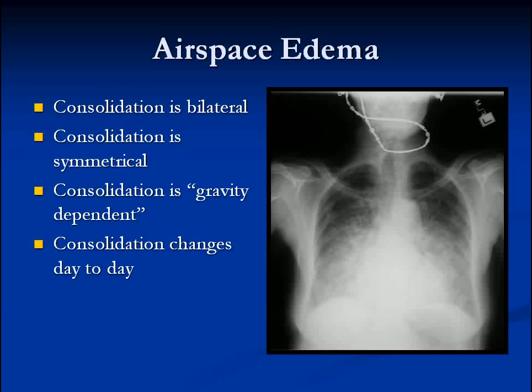Now, if you're looking at serial X-rays from one day to the next, or even 1 hour to the next, the consolidation that's due to edema is going to change. And it changes depending on the position of the patient and the degree of fluid overload. So if you have consolidation that is changing from hour to hour, this is pulmonary edema.